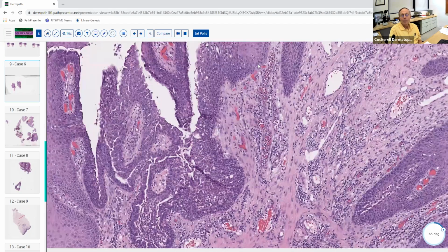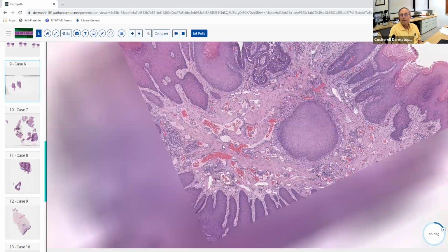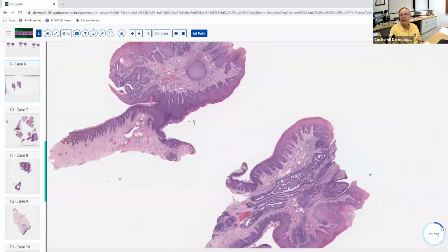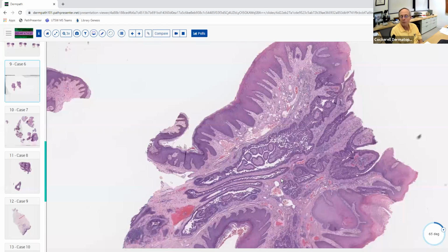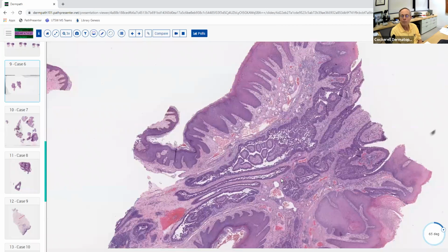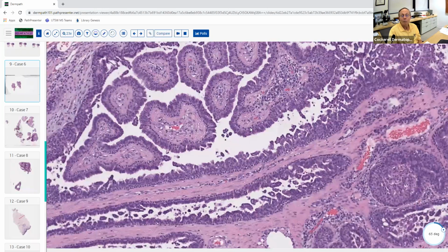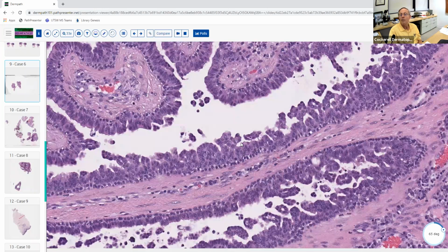Nice. Good. So again, these are kind of board 101. They very likely will show you this, or they'll show you some adnexal tumors to be able to diagnose. So just make sure you know the criteria for diagnosis. Understand that this is apocrine differentiation. It's a beautiful example of that right here. And that is decapitation secretion, as you mentioned.